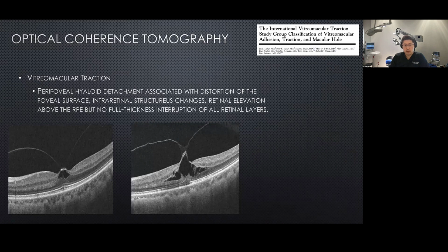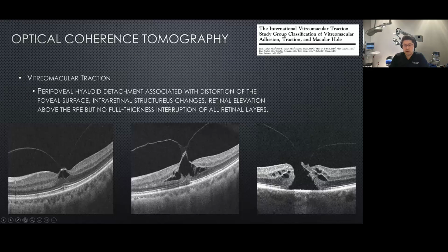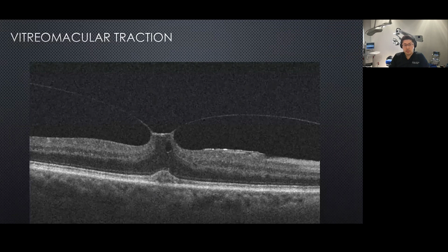Now, foveal vitreomacular traction leads to a tighter adhesion over the fovea, and as the posterior hyaloid lifts off with the process of posterior vitreous detachment, you will see either the presence of intraretinal fluid or schisis, and of course, with sufficient traction, it leads to full thickness macular hole. Of course, posterior hyaloid detachment is not equal to posterior vitreous detachment, which we discussed earlier, requires clinical diagnosis of the presence of a Weiss ring, because that's where one of the tight adhesions of the vitreous is, with the optic nerve head. And so how do we describe these on OCT?